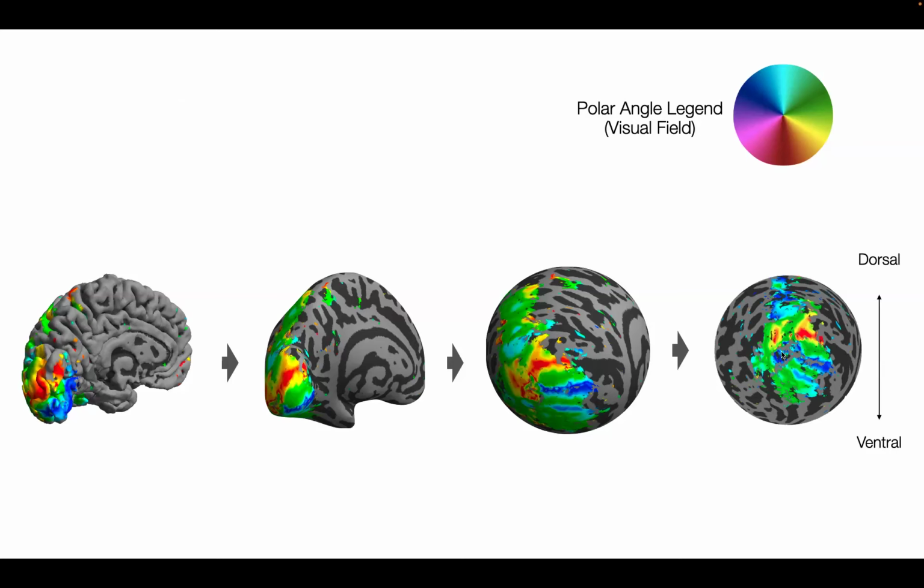The reason we like to draw on 2D maps, there are tools that will draw on 3D volumes as well, but we like to draw on 2D maps because it makes it very clear where your lines are intersecting with the brain and where they're going. Whereas when you draw on a 3D surface, it's very unclear how two points get connected across the cortical surface. That was important for us when we were doing this. It may be less important for you, but we're going to do this on 2D maps today.